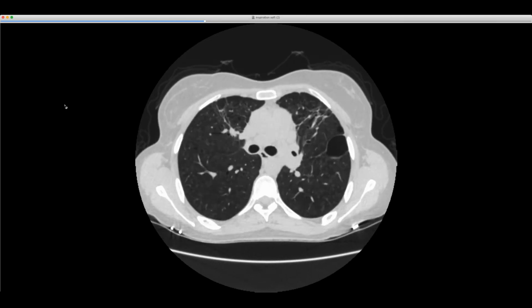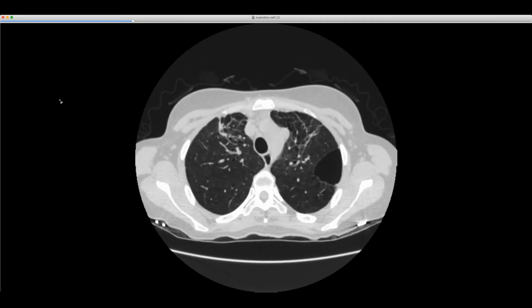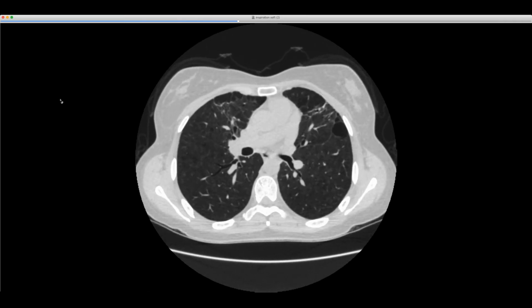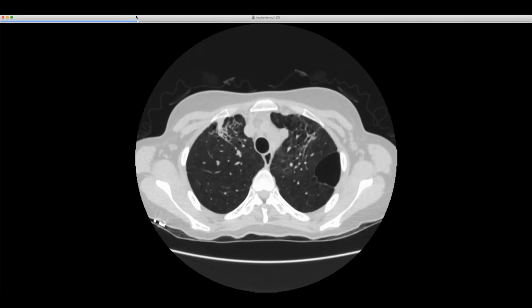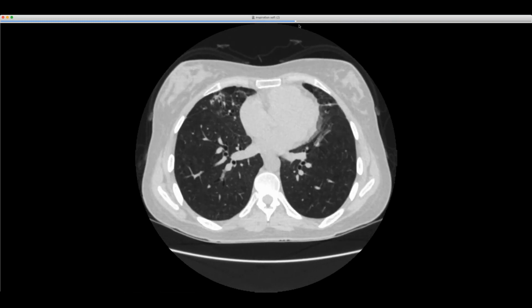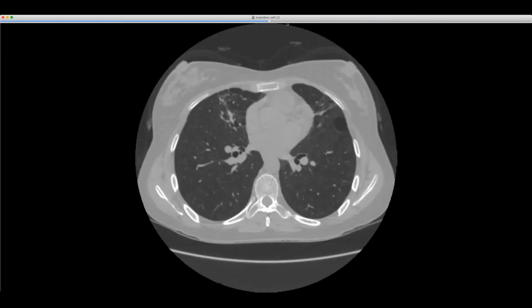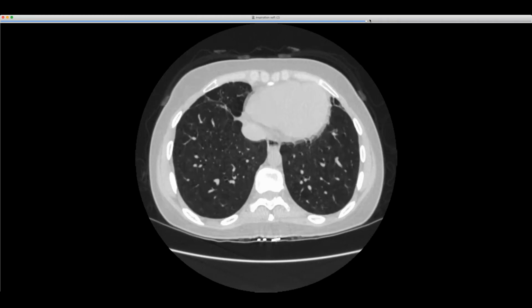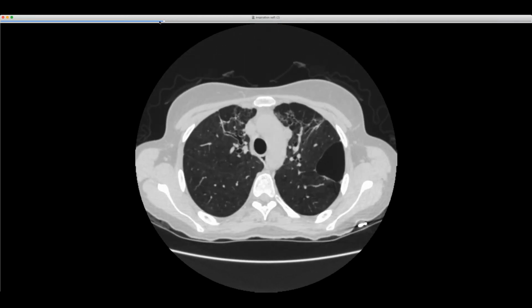So I think the etiology here is the pneumonia. Rather than invoke ARDS, that was probably a component of the pneumonia. I think this is post-infectious scarring. I think that's a better description. It's really peribronchial. It's upper lung, where the virus tends to predominate. And you don't have it in a generalized way that would go with the usual ARDS, where you get lung damage all over the place. The rest of the lung looks quite good here. So I would skip the attribution of ARDS here and just go with post-infectious scarring.